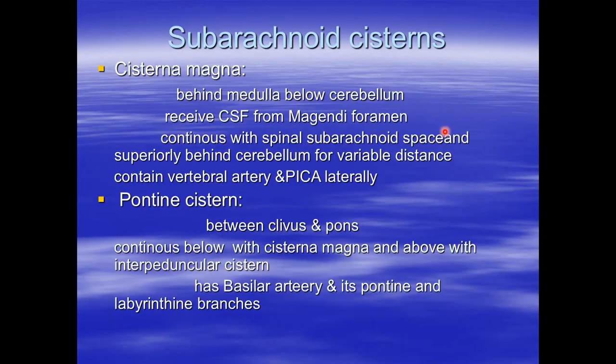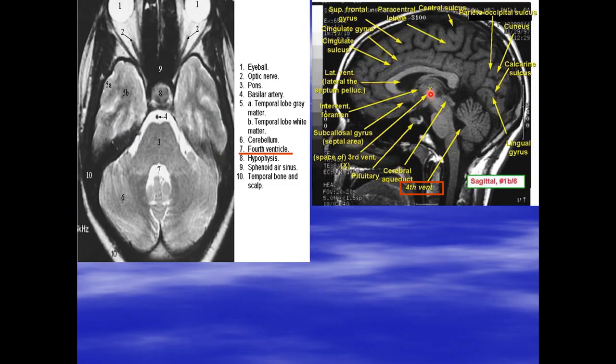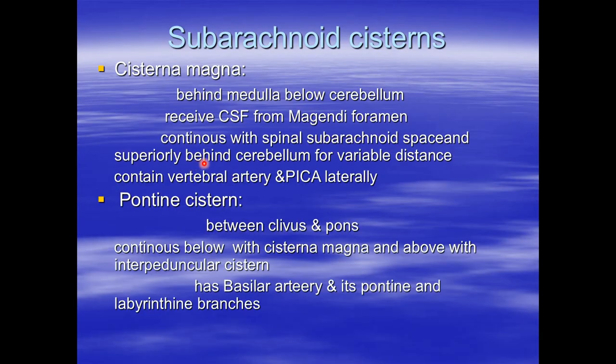Let's go back to this. Okay, we have here the interpeduncular cistern, and here you can see the pontine cistern. We will see some other images, I'm sure.